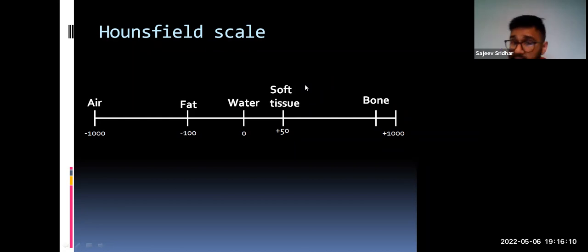And it is generally more dense than the rest of the brain. Now, the main thing to take away from this is that because the Hounsfield units of these different structures are so close together, we rely on the CT software to help us and guide us, particularly in making certain diagnoses.